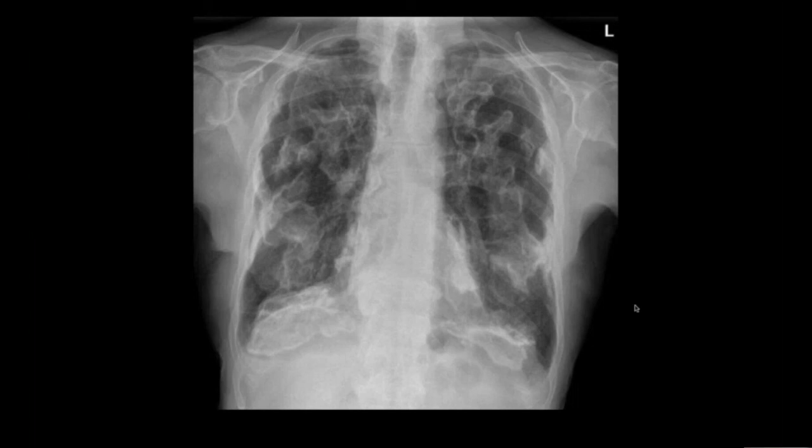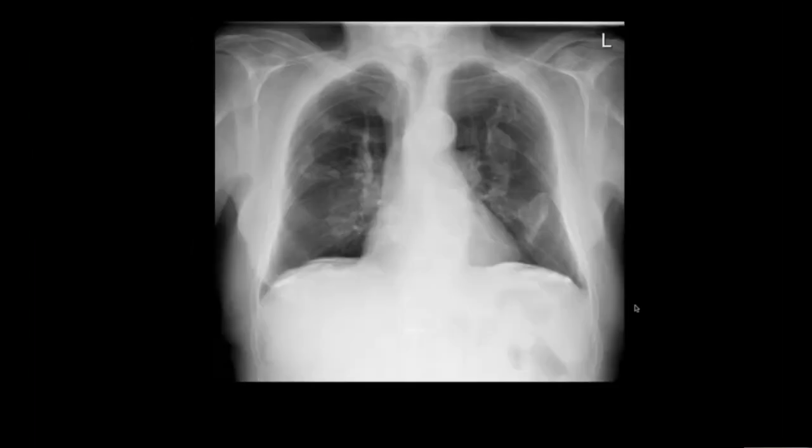On this chest radiograph, there is irregular calcification projected over the lungs and along the diaphragmatic, pleural, and mediastinal surfaces. Note that the calcification is not bounded by the fissure, hence it's unlikely to be in the lung. Due to its undulating appearance, it gives rise to the holly leaf sign. These changes represent pleural plaque calcification, most likely attributable to asbestos-related pleural disease. This is another chest radiograph showing a similar but less extensive holly leaf sign, again due to underlying asbestos-related calcified pleural plaques.